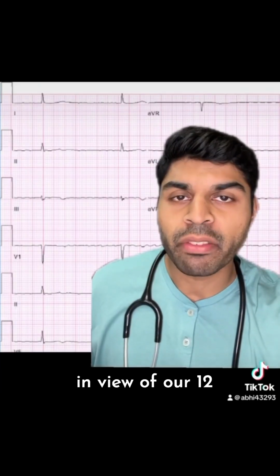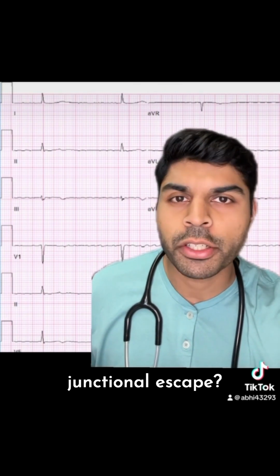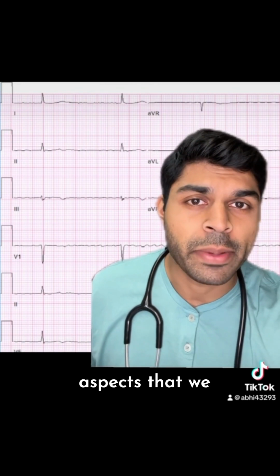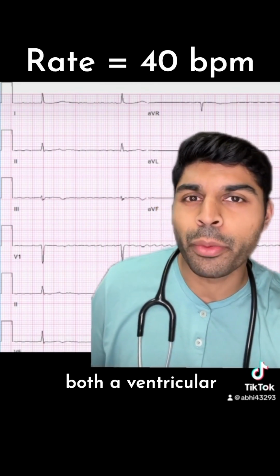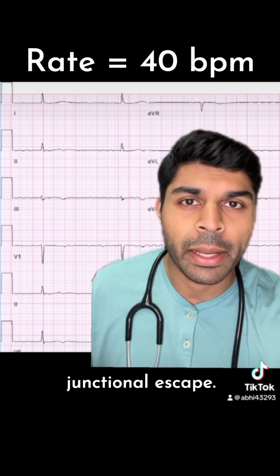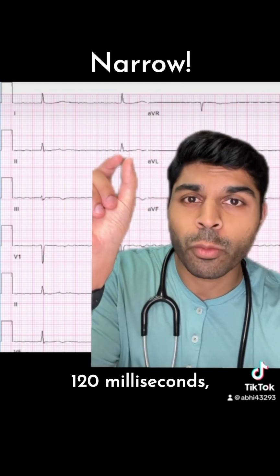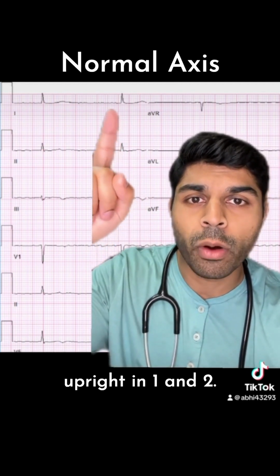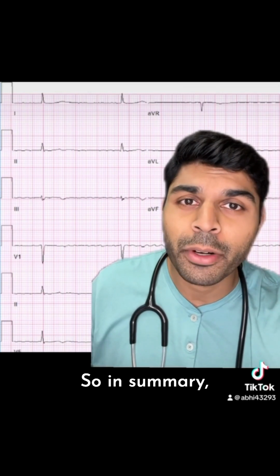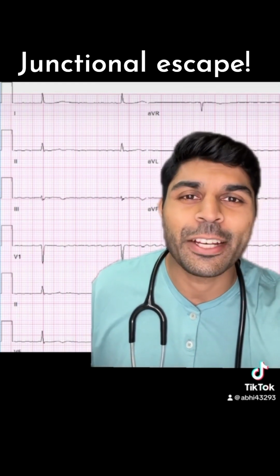Here's a zoomed-in view of our 12-lead EKG again. What do you think? Is this a ventricular escape or a junctional escape? Let's go through the different aspects that we defined earlier. Now, 40 beats per minute could be consistent with both a ventricular escape or a junctional escape. However, we see the QRS complex here is very narrow, less than 120 milliseconds, and we see the axis is normal, being upright in 1 and 2. So in summary, that's right, our patient has atrial fibrillation with complete heart block and a junctional escape.